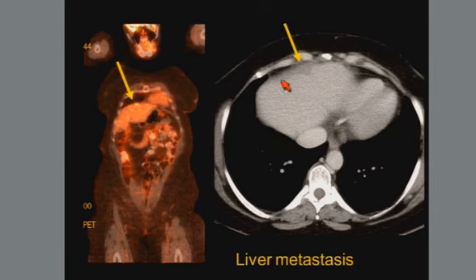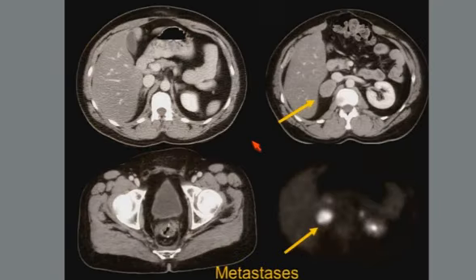This is a patient back when we were doing more PET who had what looks like a sort of ill-defined low attenuation area just in the area you'd expect diaphragmatic slips, though. So very often you see these and you sort of excuse them as volume averaging of the diaphragm, but this actually ended up being a metastasis very high in the liver.